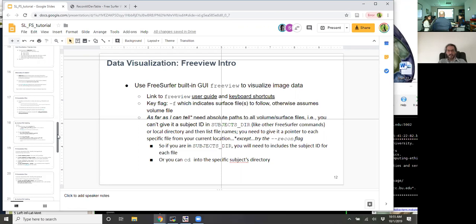It may be that you can assign a flag so that it does generate a ctab for the volume. So it's not embedded in the volume. It would just be a ctab that would have the same name. So I think if you use, I don't know if it's with mri_convert or some setting, possibly, it may generate that for you.